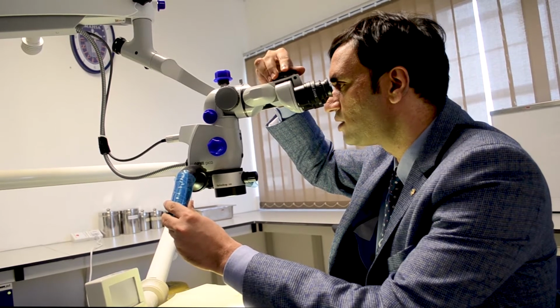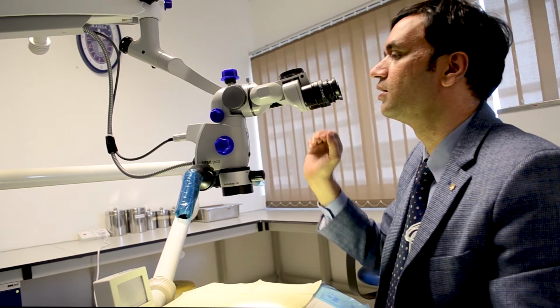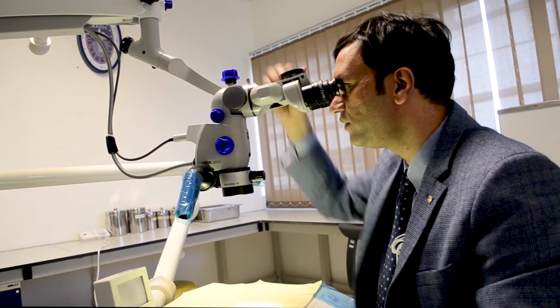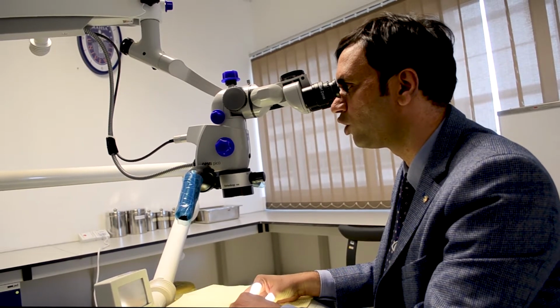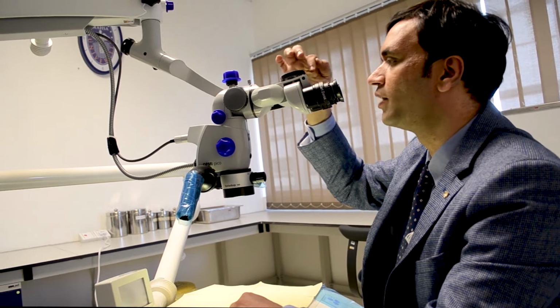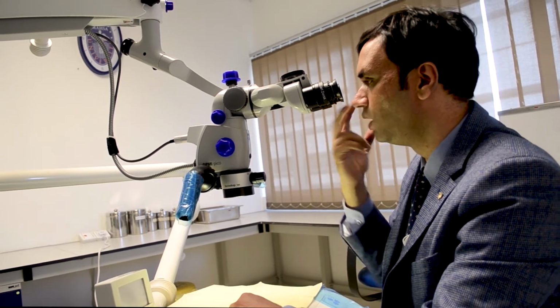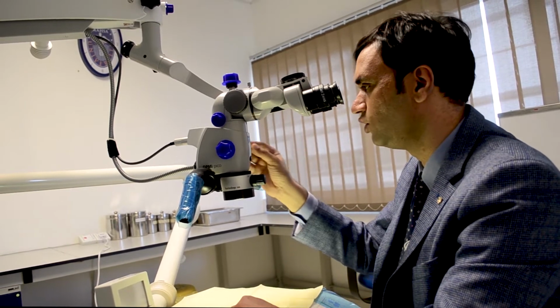Your entire agenda is to make sure that you get to one circle. Once you can achieve that, you've reached one circle image, that means you have achieved what you want to achieve. That means ultimately you check your interpupillary distance, that both the eyes are converging to become one image. That's the first thing you have to do.